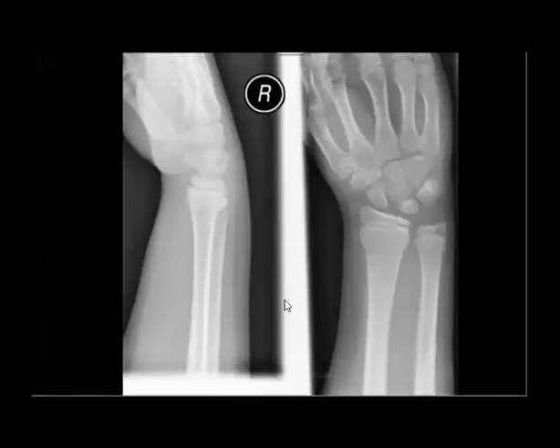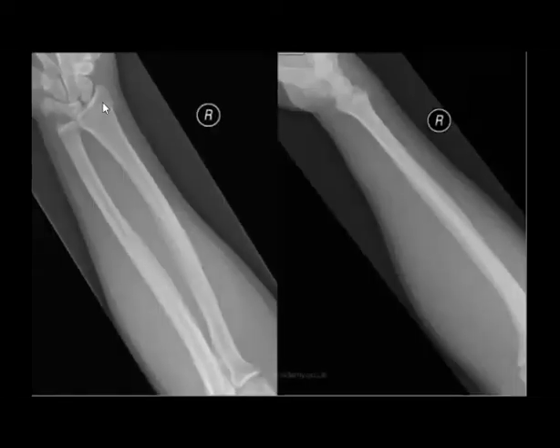Again, what is this? I think now it's a bit easy, you can find the buckling here. This is one of the commonest rapid reporting slides in pathology. They like to show you the distal radius fracture. Distal radial fracture is one of the most important checklist items that you check, especially in young age.